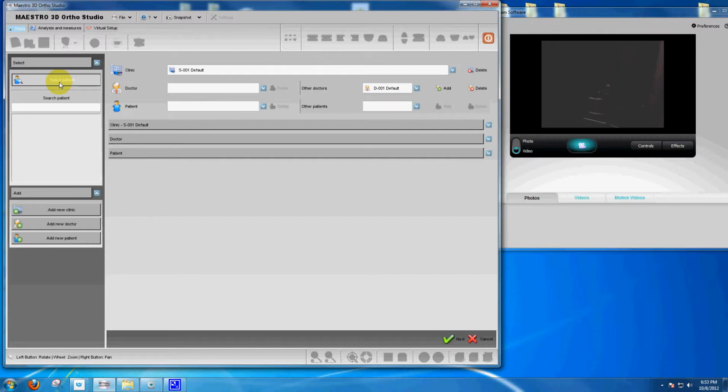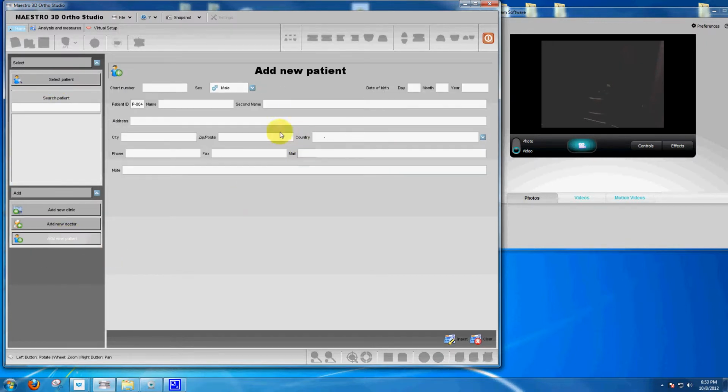Looking at the prescription, I recognize the business and I recognize the doctor, but it is a brand new patient that we're going to introduce. So I need to add a new patient to our library of patients. And the new patient is Johnny Depp. This may not be the Johnny Depp, but just another Johnny Depp.